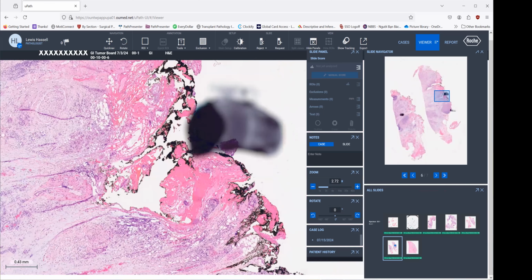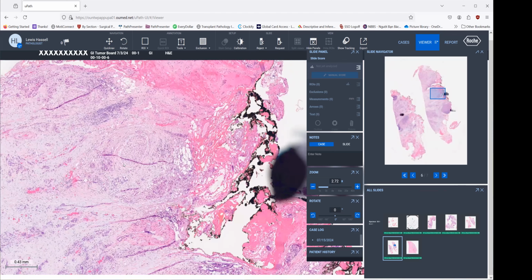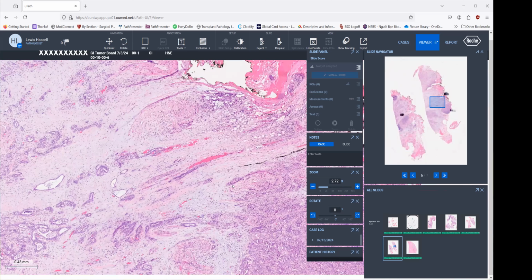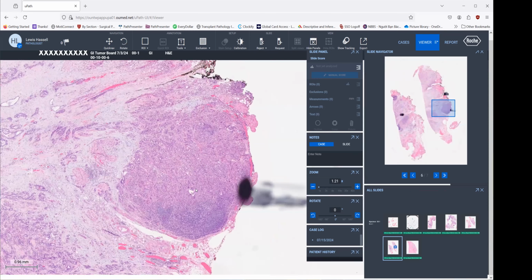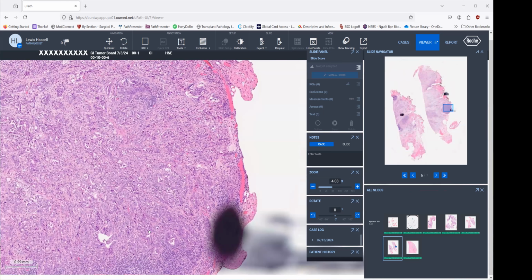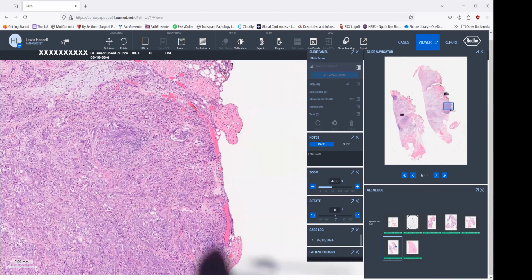Here on the frozen section, you could see cautery coming down to and involving areas of tumor, involving this perineural area here. And we also could see tumor invading into this lymph node here. So here's a lymph node containing quite a bit of tumor. Even though it's come through direct invasion, that still is, of course, staged as a lymph node metastasis.